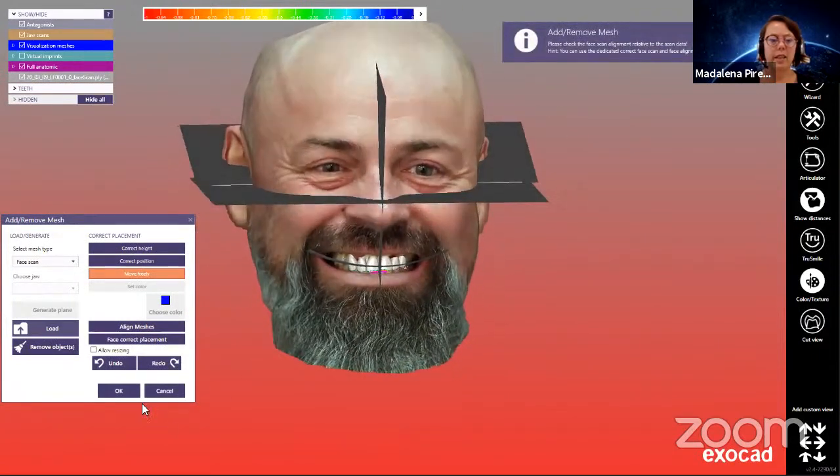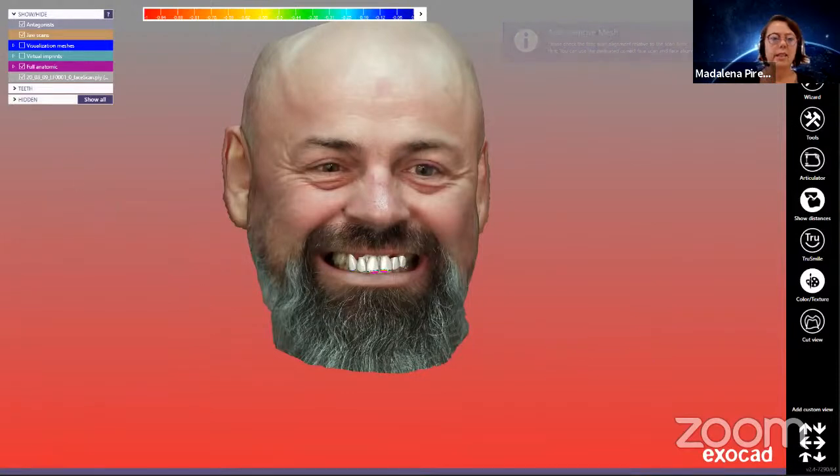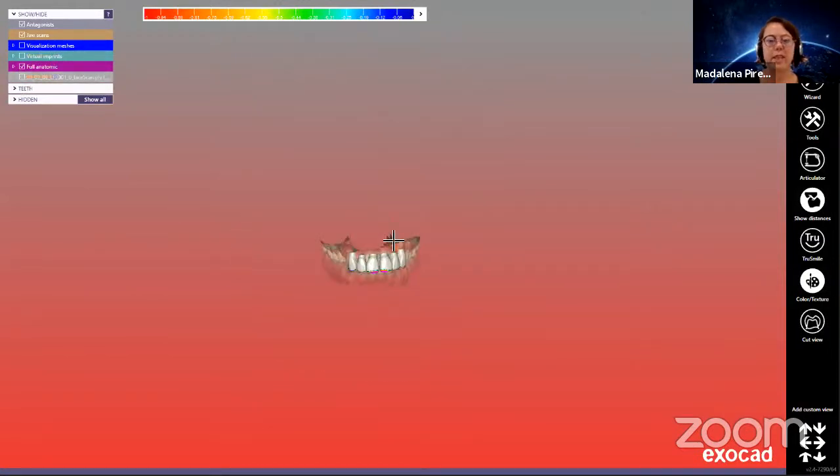As you can see, I now have all this data to position the teeth and make what I call a smile simulation, because smile design is a specific protocol with 2 pictures, but we can do some really great work already with the face scan. A lot of labs, digital labs out there, are very happy to use the face scan.